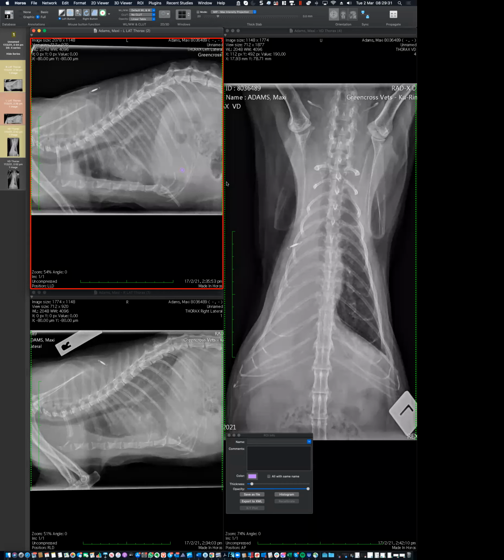Excellent, excellent. Very good point. I will have an exception to that rule, so I may say it now. An alveolar pattern is characterized basically by the increased opacity, and 98% of the time by an air bronchogram. But an air bronchogram is not necessary. Make sense? An example would be a severe hemorrhage or pulmonary contusion. There's so much fluid in that lung that it is also going into the airway. That is still a lung lobe.